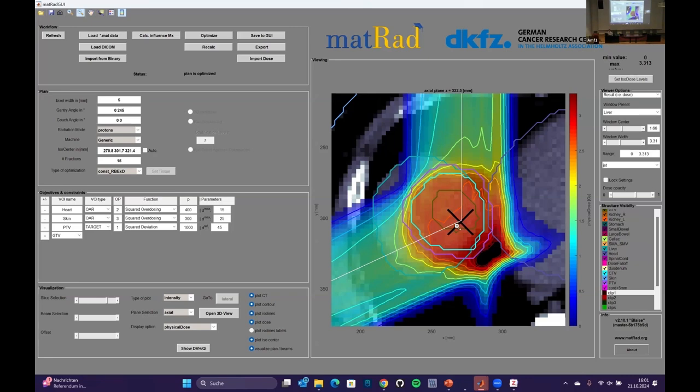And for photons, you can try this out by yourself. For photons, when you do that, the dose shifts. The dose will be moved, but it will not look as inhomogeneous. For photons, the dose is much more static when we shift it under uncertainties, which makes it much more robust. And you also see that the safety margin here didn't really help us. I think it is even a 5 millimeter margin, but it doesn't help us. The dose here is extremely underdosed, and it's extremely overdosed in this corner.